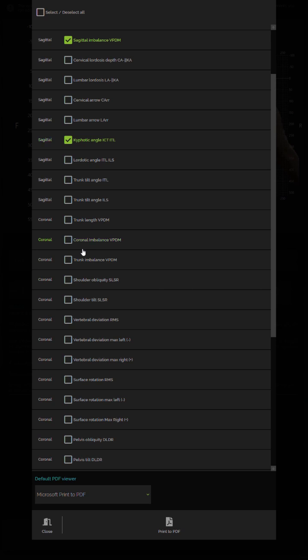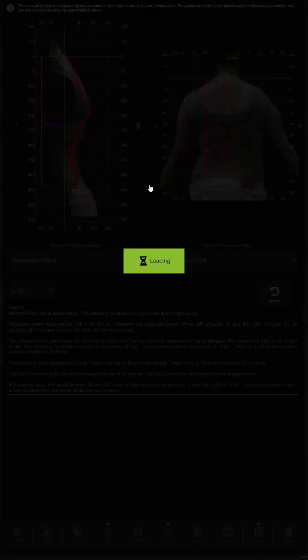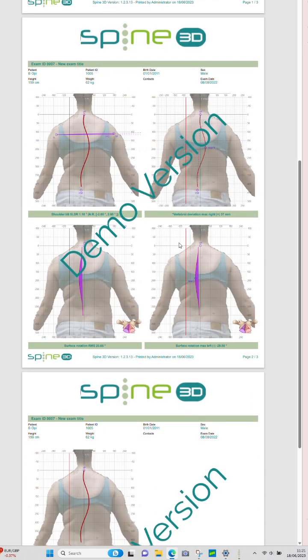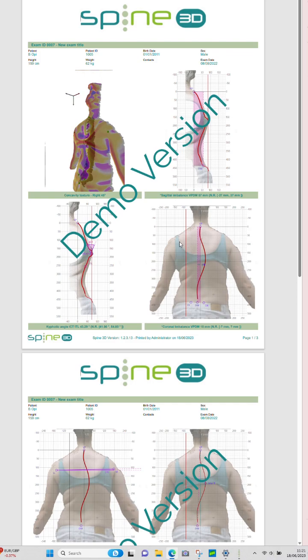Now, you can actually remove all of the different sections when creating a report. It can be overwhelming sometimes, and you can add and subtract anything that you think is relevant before generating reports. And you can see here it will then only show the areas that you've requested.